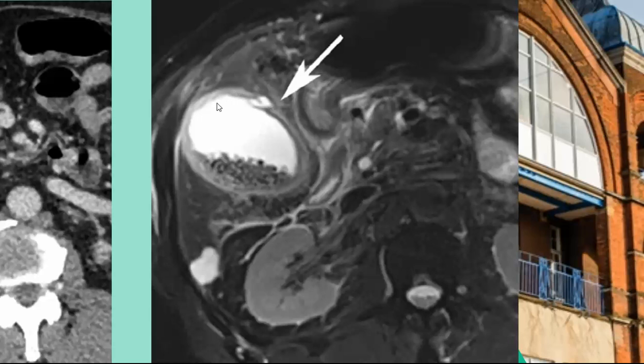MRI may show similar findings to CT, with the added benefit of this T2 weighted sequence, where you can see gallstones layering within the dependent portion of the inflamed gallbladder.